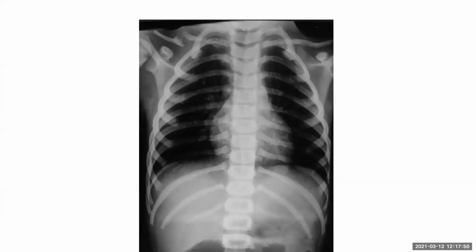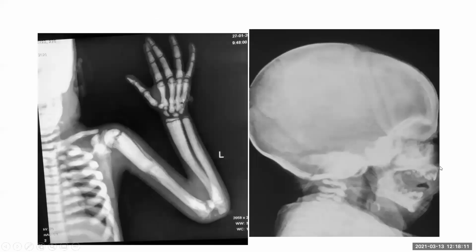The first one, as you said, there is increased bone density, and of course, this is a clavicle fracture. So osteopetrosis is another differential in children, which is very important. A history of trivial trauma giving a fracture in brittle bones. Remember the marble bones of children. This was another fracture through the arm. You can see the vertical lucencies along the metaphysis, and these are the typical bone within bone, the sclerotic base of skull and all that. And the angle of mandible is important.